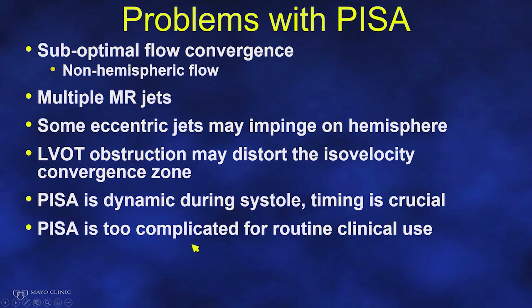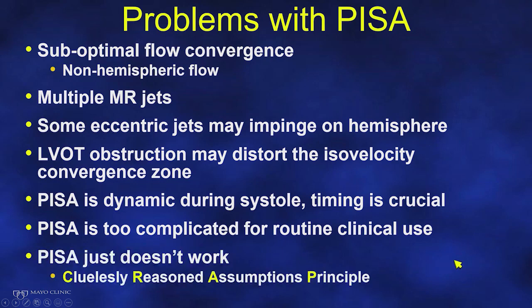And some people think it's just too complicated for routine use. One of my mentors, Dr. Pandian, likes another four-letter word for PISA: cluelessly reasoned assumptions principle. And you can see what the four letters mean.